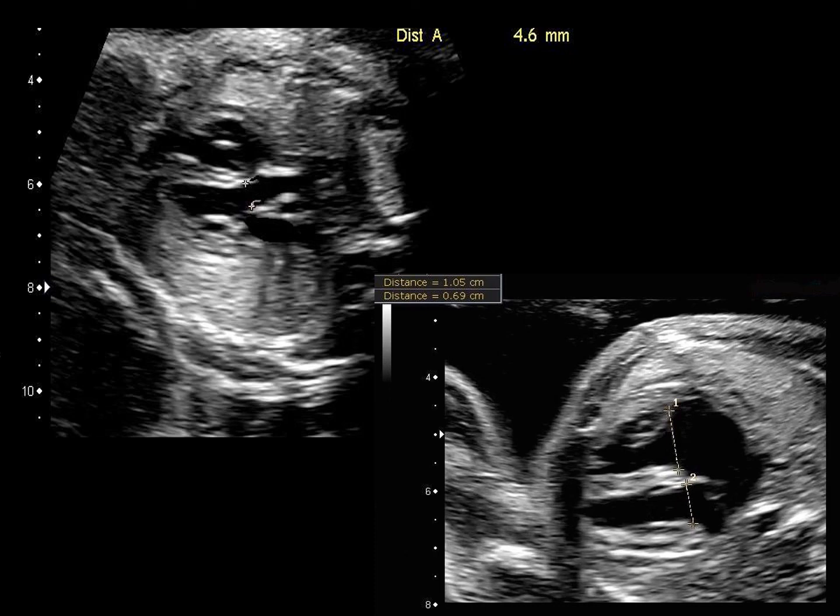And I wanted to put this in here because this is important in learning how to measure the semilunar valve annulus and the atrioventricular valve annuli, and specifically tricuspid valve annulus and mitral valve annulus. These are all measured in terms of the AV valves when they're at their max opening, which is early to mid diastole. You can see the hinge points of the valves, and so we'll measure hinge point to hinge point, internal edge to internal edge for the AV valve measurements. And then semilunar valve measurements, this is the aortic valve, again, hinge point to hinge point at the valve's maximal opening. And so this is the correct method to do that.